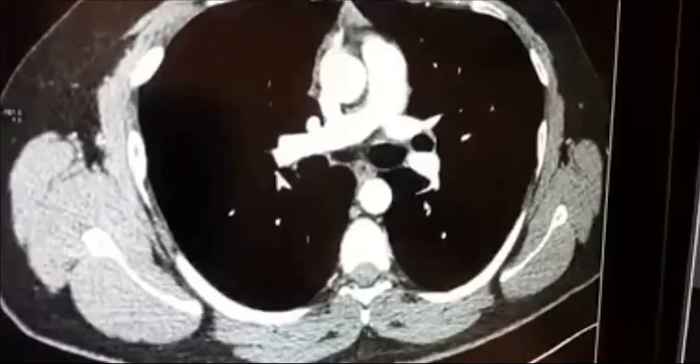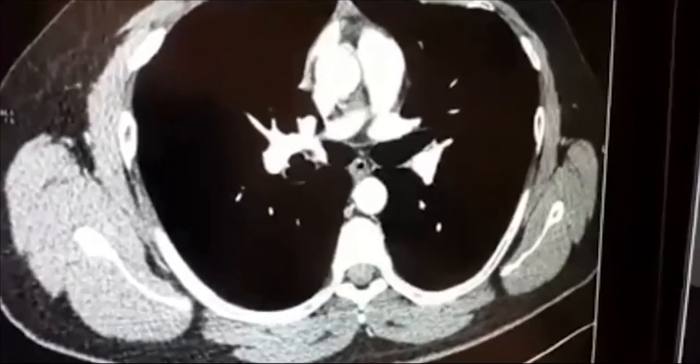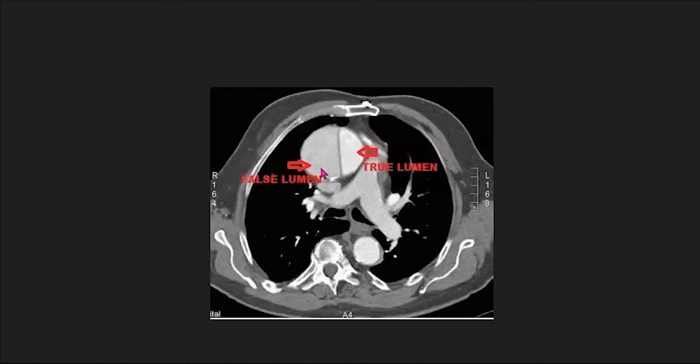So let us go down. Now, before proceeding, let me give you some clinical importance of what pathology can be seen at this level, regarding the ascending and the descending aorta. So let us understand the various pathologies of the arch of aorta. Sorry, ascending aorta and descending aorta.